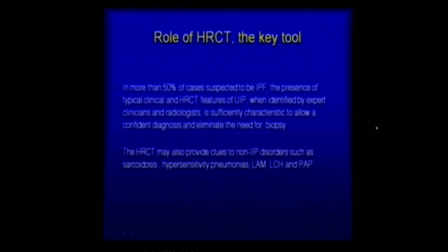This is important. When you talk about idiopathic pulmonary fibrosis or any of these groups, individual members of the idiopathic interstitial pneumonias, you are essentially excluding the other lesions for which the volumetric acquisition of images helps. Even though you are talking about a thin section HRCT, nowadays it is not taken in a stop and move technique. Previously we used to take 1 mm section, patient moves, again 1 mm, patient moves, again 1 mm. Now it is not like that. Actually we are acquiring the whole thing as a volume after the advent of MDCT, and from that volume we are reconstructing 1 mm sections. So that is what is now being done.